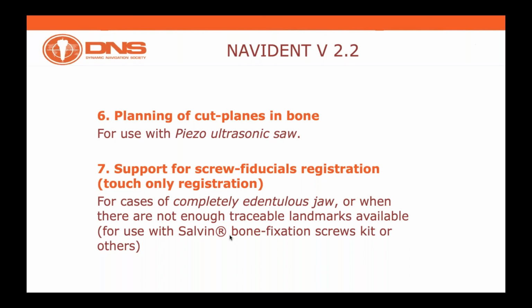In order to overcome those challenges, we will introduce this protocol of screw-fiducial registration, where screws are placed either by fixing them on the patient's jaw, or by using what we call a Navibite.